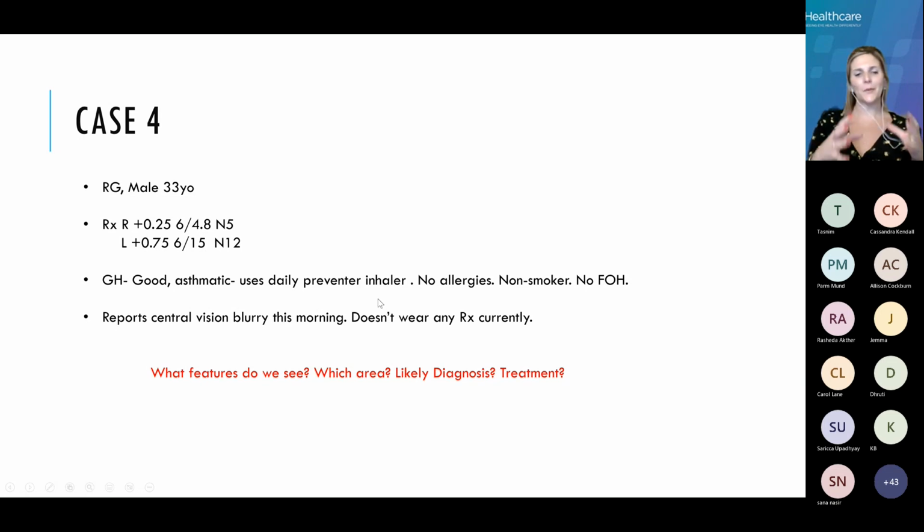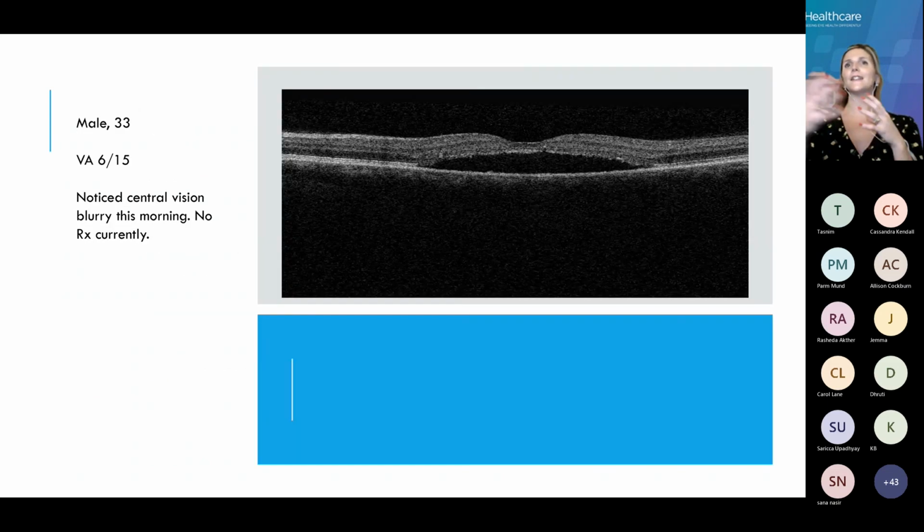Now, this is important, isn't it? Because you've all got it before I show you the image, because you've looked at all the information with that patient. So not necessarily needing to have the B scan. The B scan is going to confirm what you were already thinking, and that helps you then to understand, to educate, to be able to move that forward if you need to. So quite right, you've all started to look at the clinical history and build that into the story of our OCT interpretation journey, which is really what we're doing here.